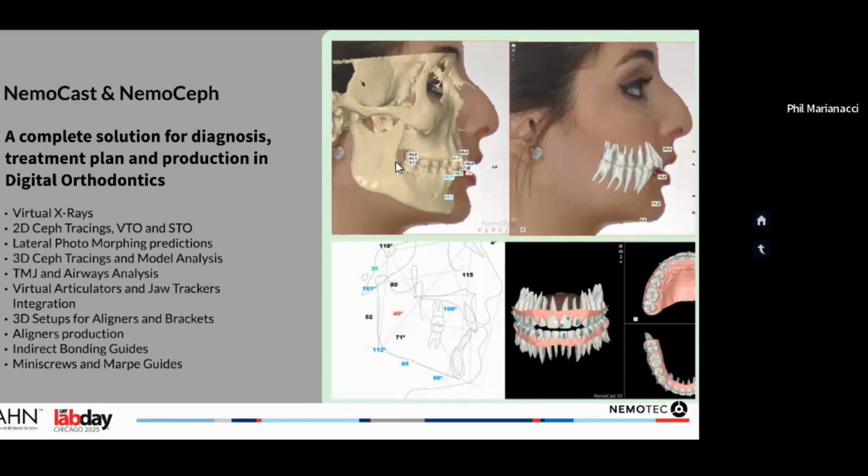So sometimes if we're planning a case and it's an all-on-X case, and we may be doing a max all-on case, but we want to do some ortho treatment on the lower, on the mand, we bring the orthodontist in here, and they will give some options, and it works really beautifully that way. As you can imagine, it's really hard getting everybody on the same page, or getting all the information in one place. When it's all in one place, you can make better decisions, which is beautiful. That's just my perspective on it. But the orthodontists do use this for multiple different things.